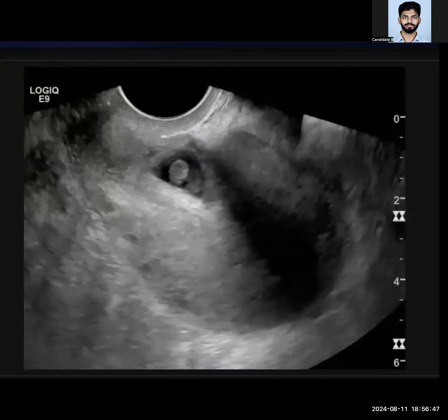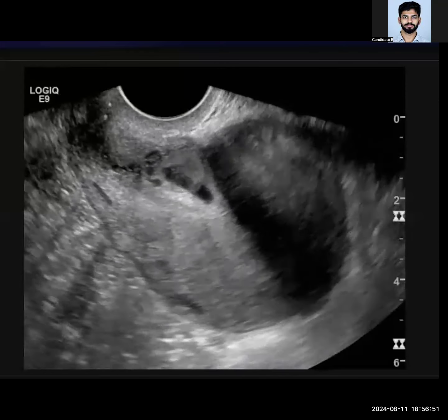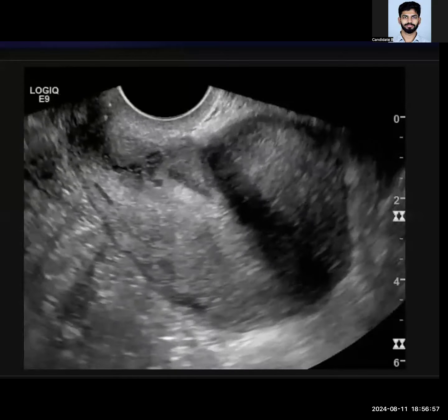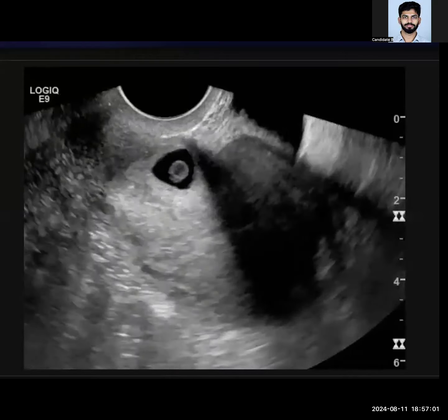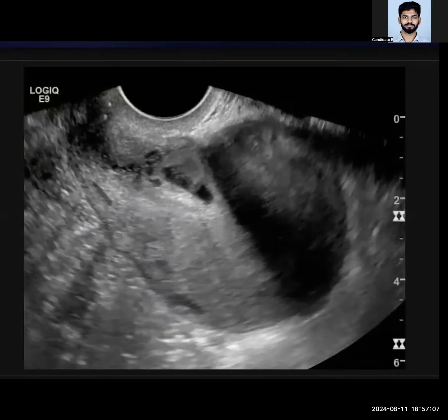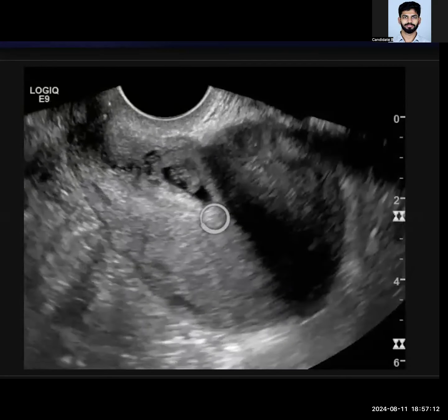I can see selected cine images using curvilinear probe ultrasound. I can see that the uterus is bulky, enlarged, and I can see that there is a scar in the anterior lower section, lower anterior uterine wall. I can see a gestational sac overlying this location.